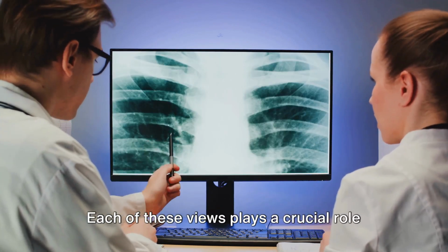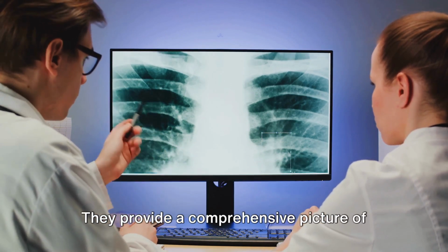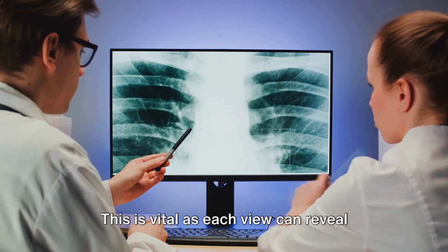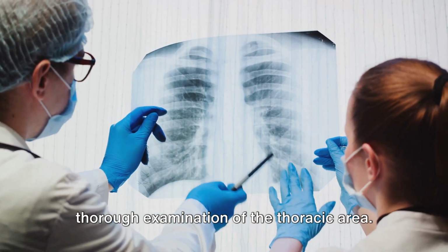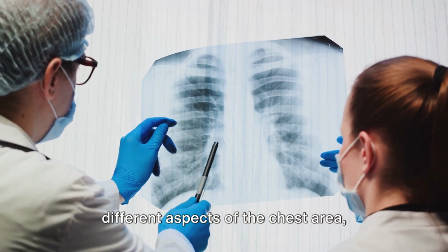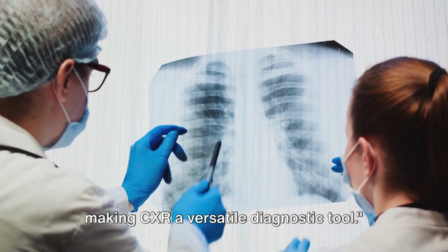Each of these views plays a crucial role in the interpretation of a chest X-ray. They provide a comprehensive picture of the chest area from multiple angles. This is vital as each view can reveal different aspects of the chest anatomy, and combined together they provide a thorough examination of the thoracic area. These views help doctors to visualize different aspects of the chest area, making CXR a versatile diagnostic tool.